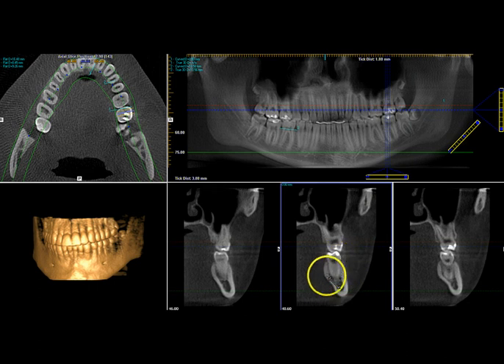It'll be good for looking at the mandibular submandibular fossa that would be here. So it's a good way to figure out, if you're looking from the top, you don't have a CT, you're like, oh, sweet, I got 14 millimeters of width. I mean, you can do anything you want, but in reality, for most of it, a lot of it is not supported. So basically, in reality, you only have about 9 millimeters of space.